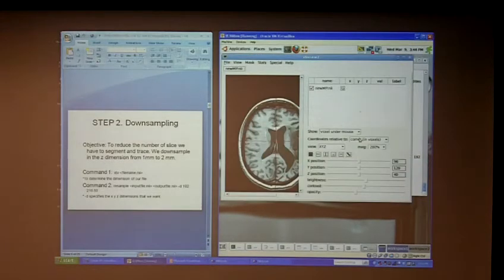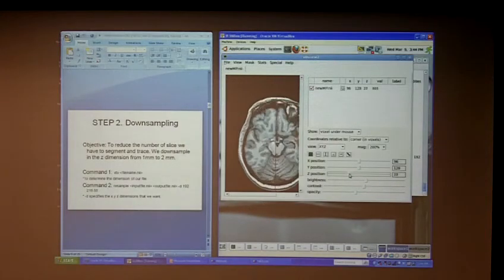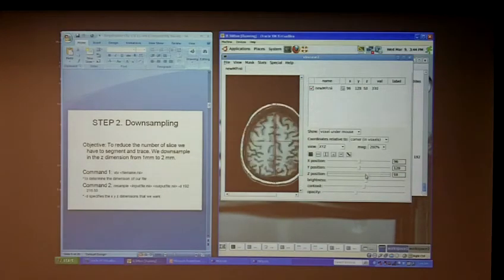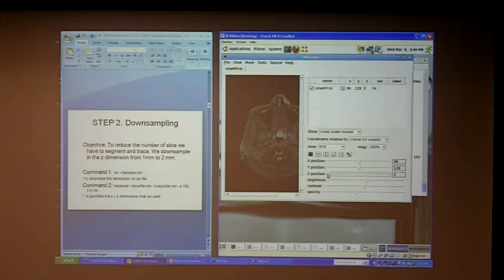So you just define the number of slices in the Z dimension? Yep. I just define the number of slices in the Z dimension, to cut it in half, and basically I now have half the number of slices to trace. Right. So if you actually look at the slider here, you'll see that it goes to 80. VoxBo considers 0 an integer. Other programs like in Windows, 1 is actually an integer. So that's why it says, yeah.